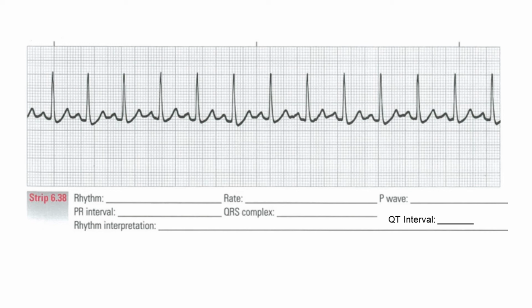If you did a 6-second strip, you're going to check right within. Now, this one's a really hard one. Is it really just off the 6 seconds? So I'm not going to actually count that first one. So you have 1, 2, 3, 4, 5, 6, 7, 8, 9, 10, 11. So your heart rate's about 110. Multiply that by 10. But more exact, it's 106. So basically, it's over 100. So your heart rate's 106 exactly.